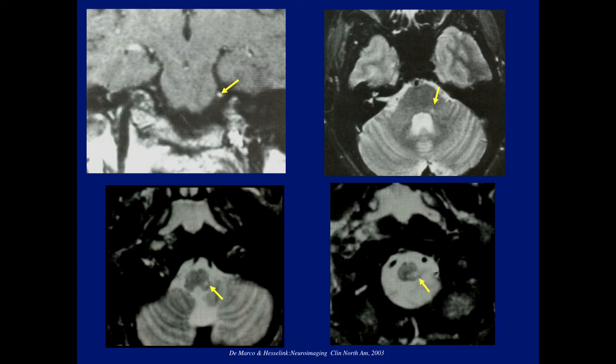And what's the condition causing that, as I showed last time? Correct. As Eric pointed out again, this is herpes. So herpes involving the cisternal portion of the nerve as well as the trigeminal spinal tract going down to the medulla.